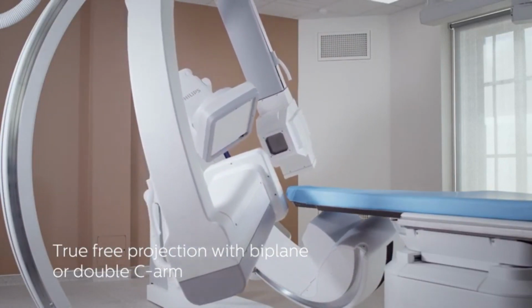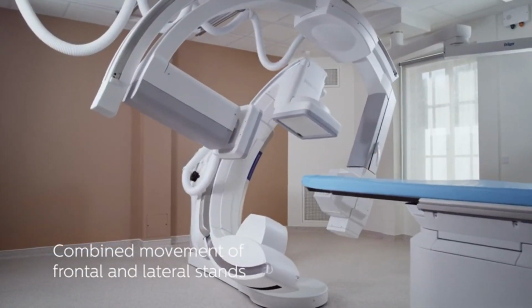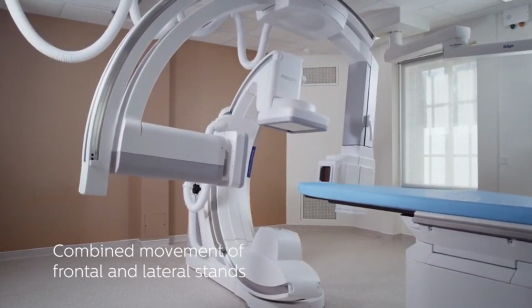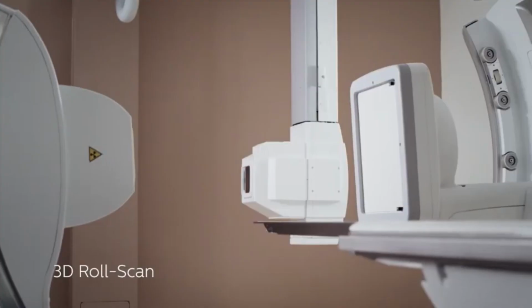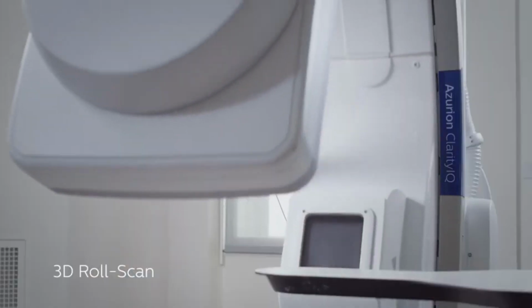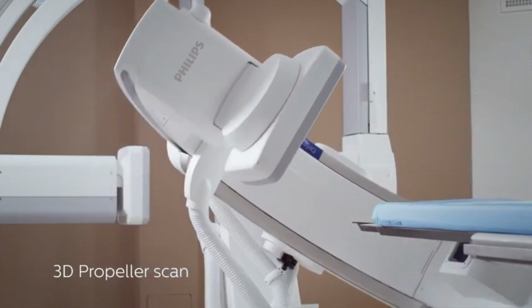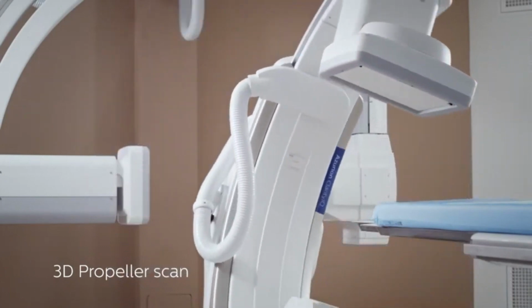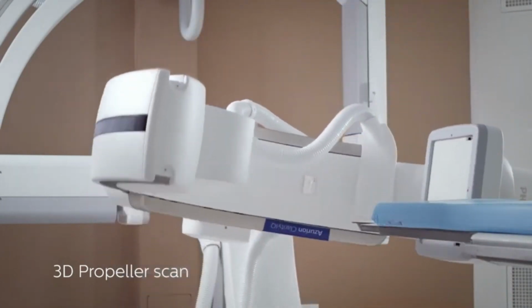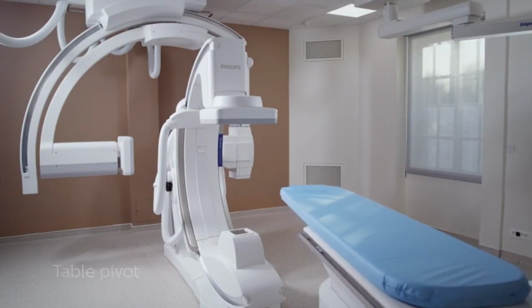Biplane cath lab systems acquire 3D images much faster than single-plane cath labs. That's because they capture image data from detectors on two axes instead of one. However, single-plane systems are also capable of 3D imaging. However, it takes longer for the C-arm to move, so the software's reconstruction process can cause a delay. Biplane systems come with 3D software standard, while it must be added to single-plane systems.